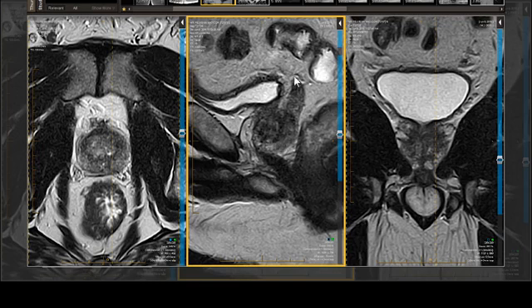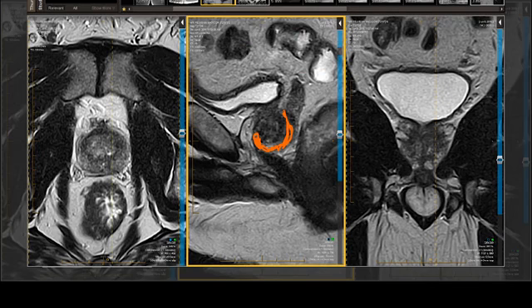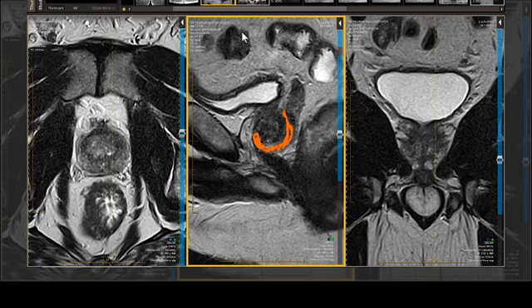So let's draw over our peripheral zone. Take whatever color we've got. It's got this sort of J-shaped look, and look how anterior it goes. And then this darker area in front, very slit-like in this projection. I'll make it even a little smaller line. And this time I'll make it pink just to stand out, is the anterior fibromuscular stroma.